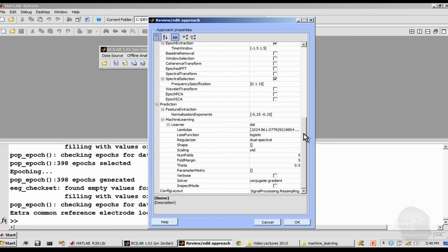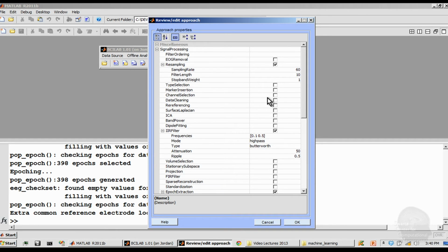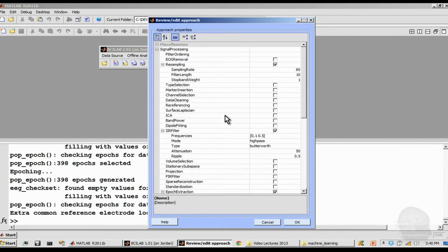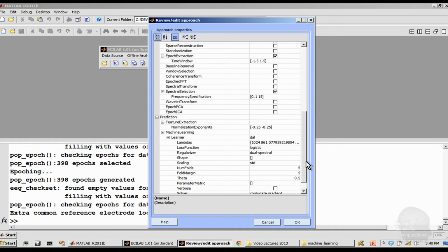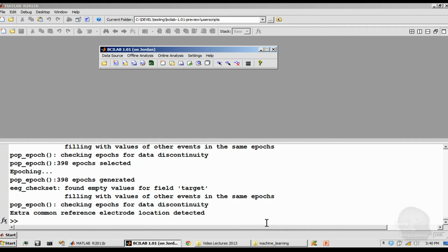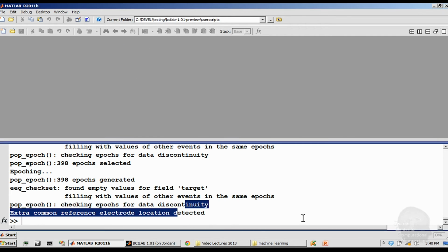All the stuff that shows up in the GUI is harvested from disk. So if you put in a new function somewhere that you just coded, it'll show up here. You can immediately configure it and use it with existing or new methods. And also all the help and so on comes from there.